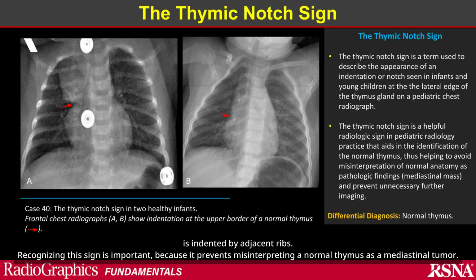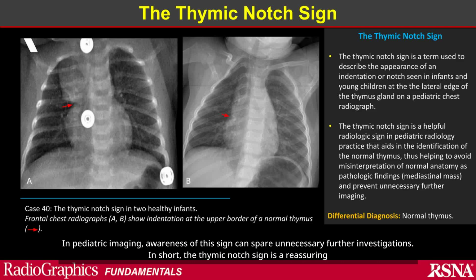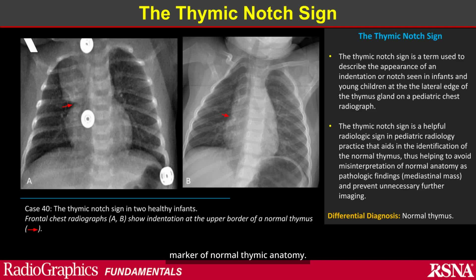Recognizing this sign is important because it prevents misinterpreting a normal thymus as a mediastinal tumor. In pediatric imaging, awareness of this sign can spare unnecessary further investigations. In short, the thymic notch sign is a reassuring marker of normal thymic anatomy.